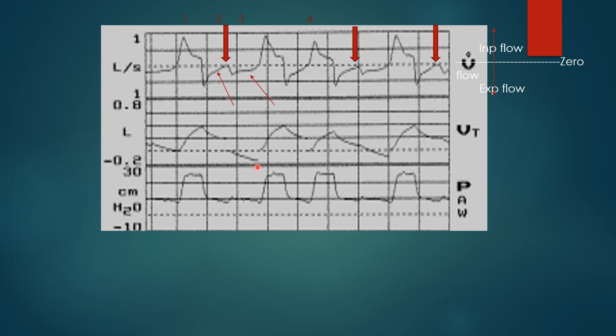This type of dyssynchrony is really common, and it's often caused by COPD patients having this air trapping problem like this, and you'll see this on those patients. And also patients with pressure support set higher than is reasonable for that patient. And sometimes that might only be like 12 or 14 of pressure support.